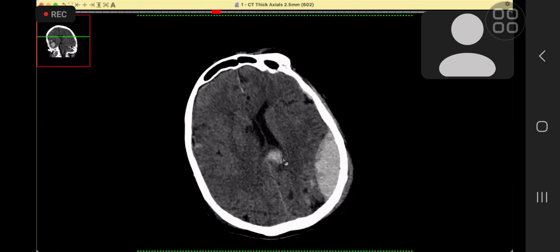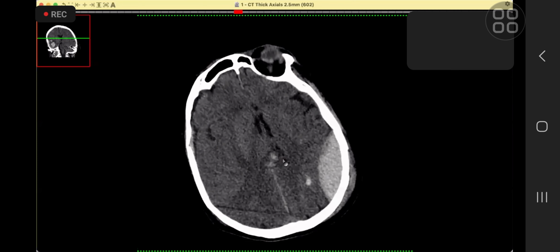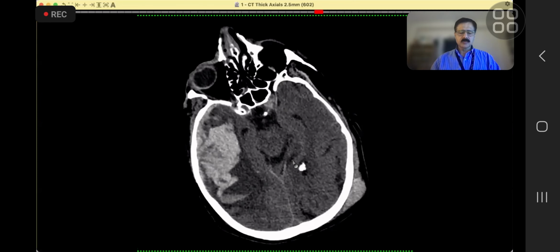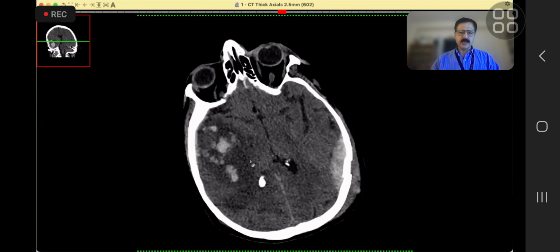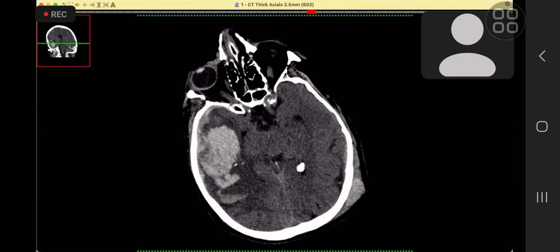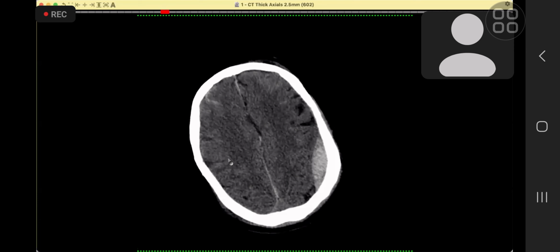Right. So, anything else? This thing, you have described it as an intraparenchymal hemorrhage? Yeah. How did you describe it? It has a similar appearance to the other focus that you just pointed out as well. Okay. It also doesn't mention.